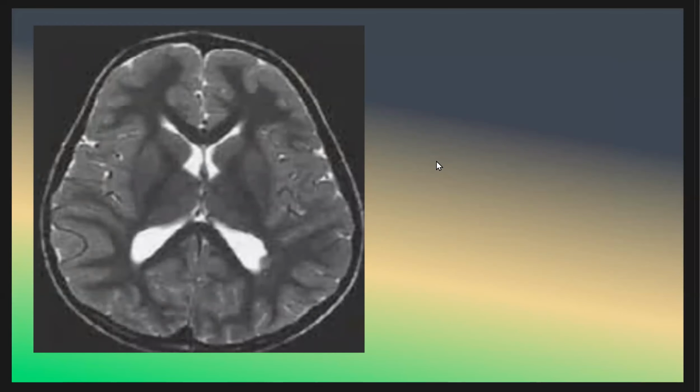What do you think the patient has in this next case? Okay, as we see here, this is T2, and we see subependymal heterotopic gray matter adjacent to the left occipital horn and isointense to the gray matter.